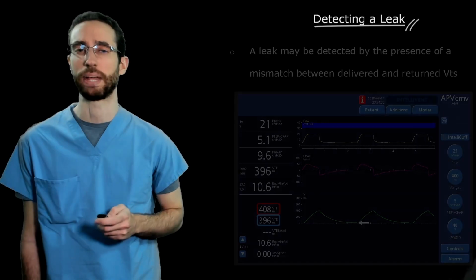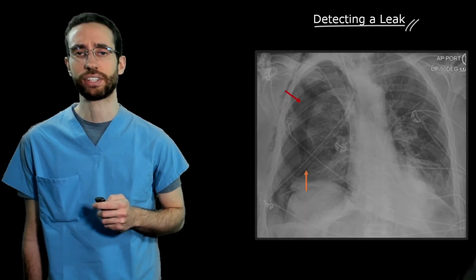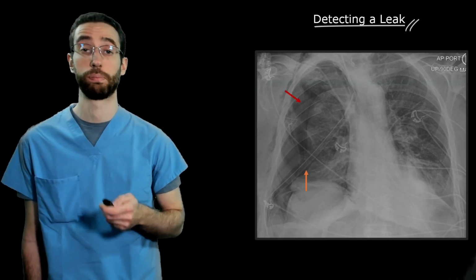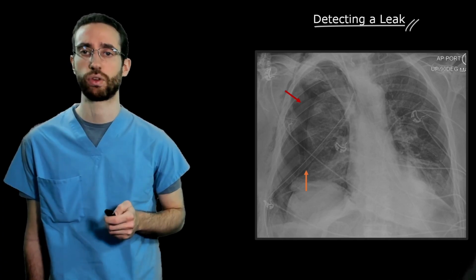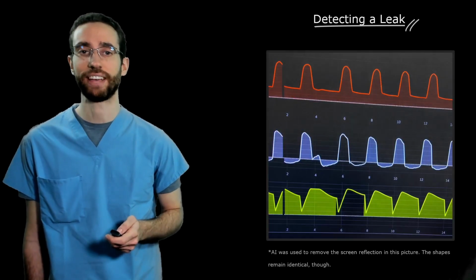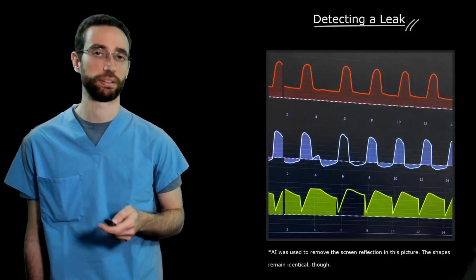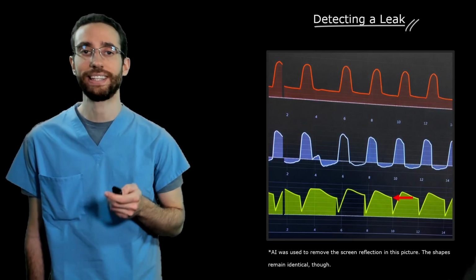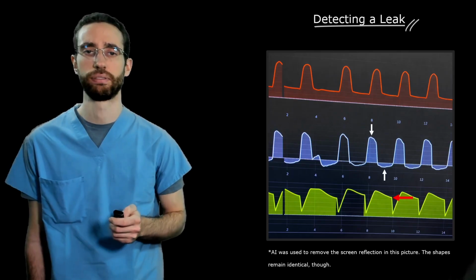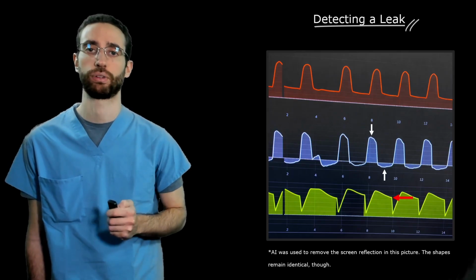The same graphic information can be obtained in the flow time graph in a slightly different way. Look at this case of a patient with esophageal cancer who underwent resection that was complicated by a tracheal-pleural fistula. You can see on chest X-ray the presence of a pneumothorax that was actively being drained by a chest tube. On the ventilator, you can see the same sharp reset now in yellow on the volume time curve. On the white flow time curve, note how the area under the curve on the inspiratory portion of the waveform is larger than on the expiratory portion.